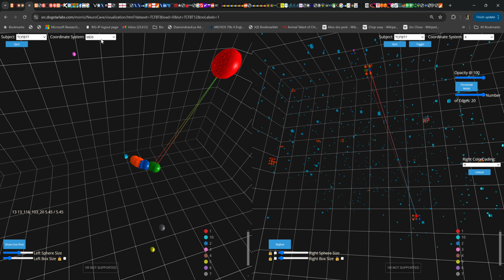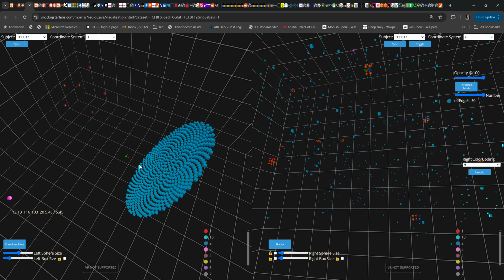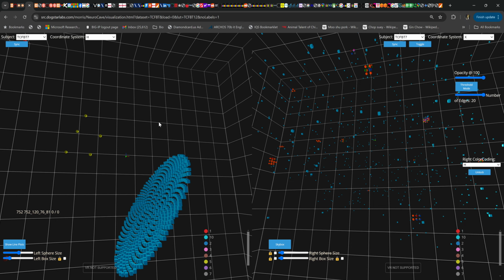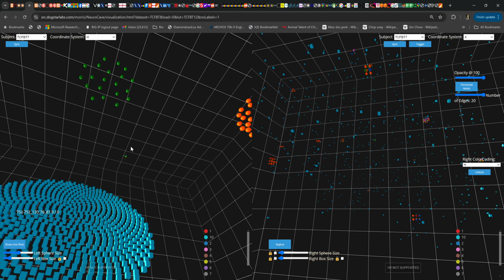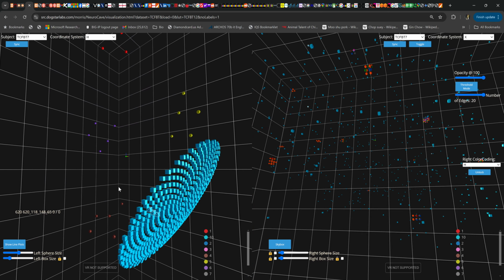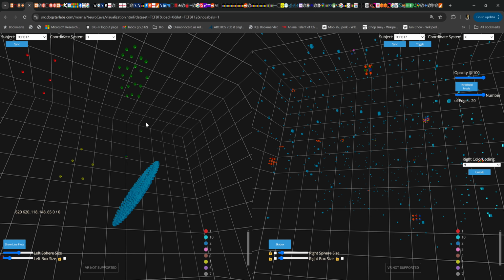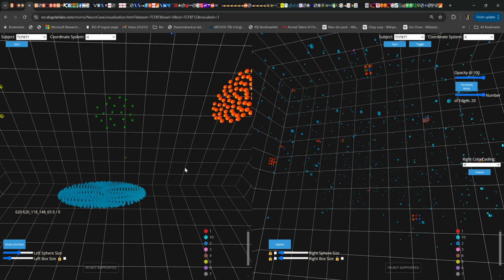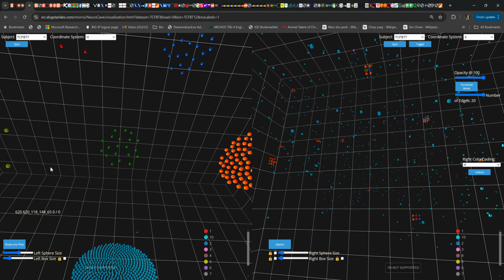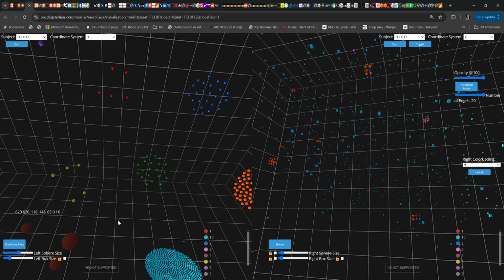We can also rearrange the nodes to really separate out the clusters into their own artificially positioned cluster regions that are just clustered together on the faces of a platonic solid.